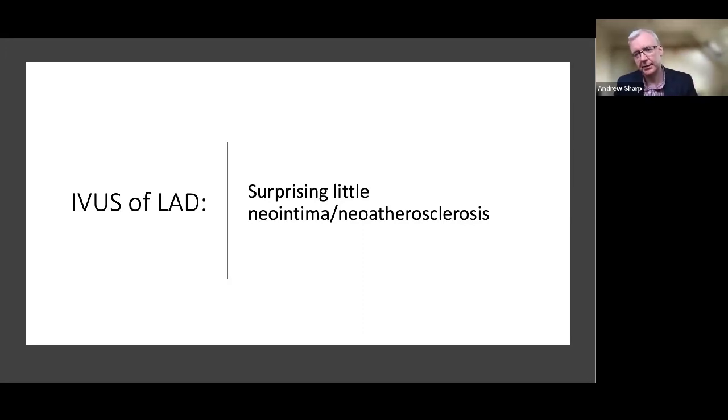And so there was a study that showed that the correlation was under 0.5 for could you predict the diameter between the first septal and the mid-diagonal. And it was almost impossible to guess what the media-to-media diameter was accurately and consistently, because we can't appreciate the amount of septals coming off, because some of them are even below the resolution of angiography. But it gradually tapers the LAD from that first septal point onwards.